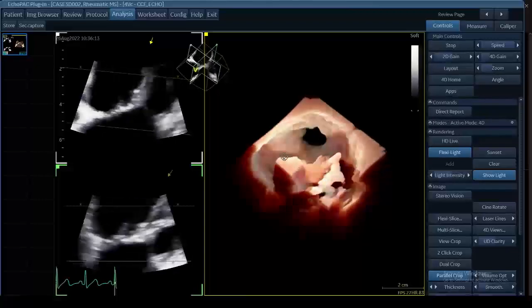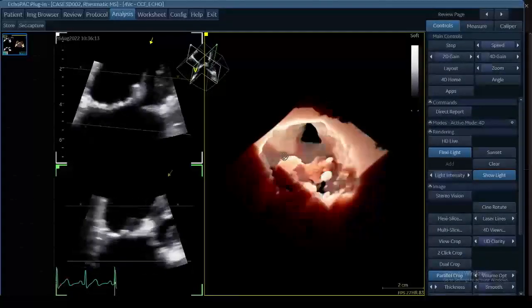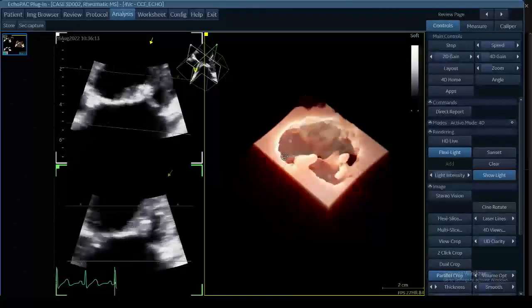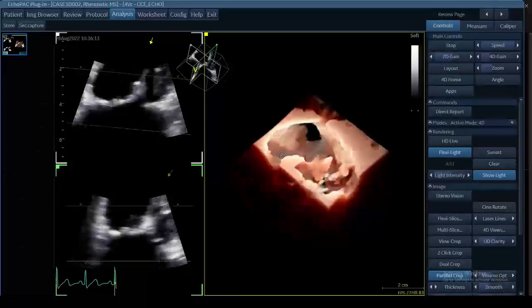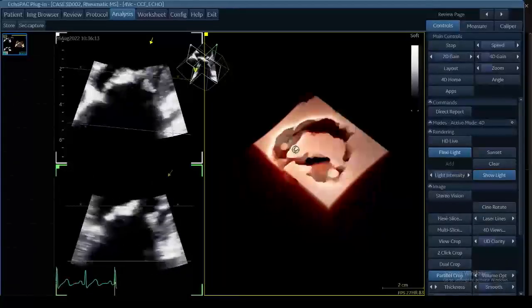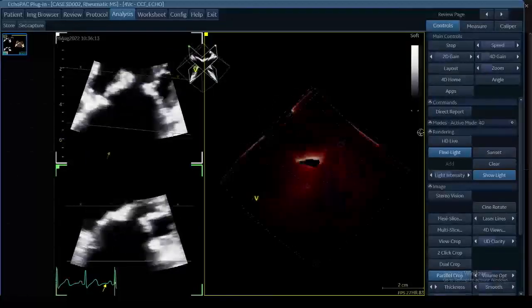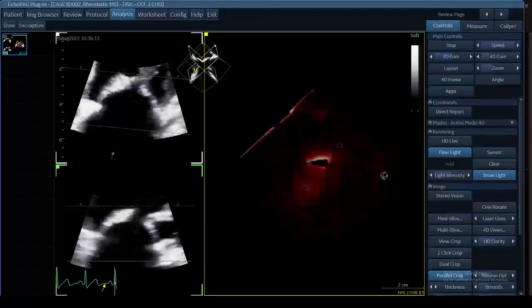It's fun. Sometimes I think it can be helpful when you're looking at 3D structures and you want to be able to see movement in 3D space. Sometimes I think these actually can be clinically helpful. A lot of times, we're doing this to create a pretty image just to help highlight what we want to look at. If we wanted to look over at the atrial side, we could just flip this whole data set around.